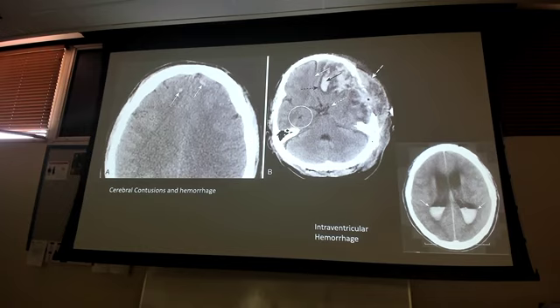Okay. Here's the intracerebral hemorrhage. This is from the damage in the skull fracture, right? If I follow my skull bone all the way around and I come in here, I got my fracture, I got my swelling from the injury, and now I'm bleeding into the intracerebral area. Fracture, swelling, bleeding, and then I'm starting to get some of that mass effect shift. The white dotted arrow is showing the subarachnoid area kind of getting shifted over to the other side.